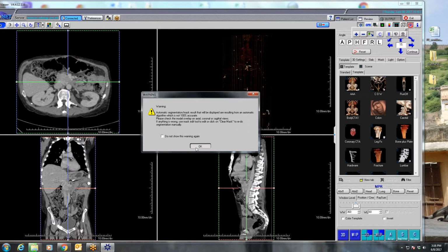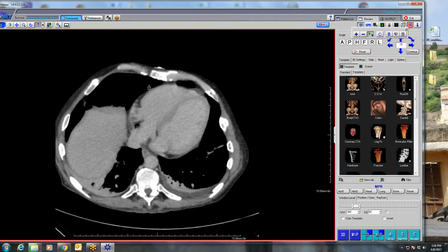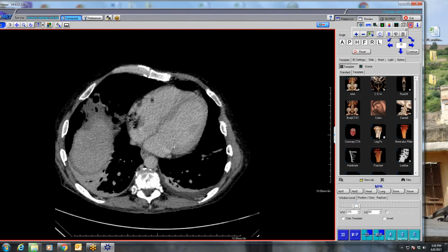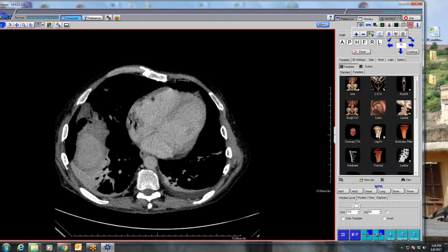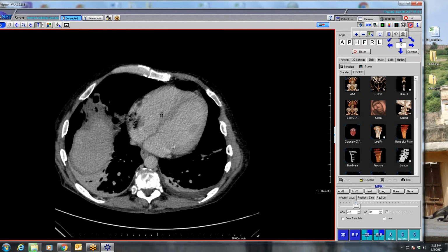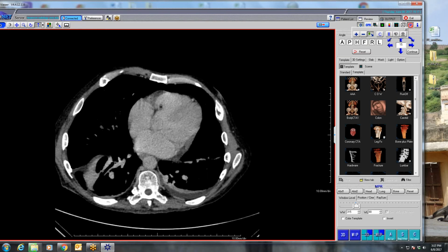The echocardiogram saw a mass in his heart, and they got a CT. One of my fellows was looking at this, and I said, well, usually you don't see air in a mass. This is presumably some form of endocarditis or vegetation, because you usually don't see air within the structure.